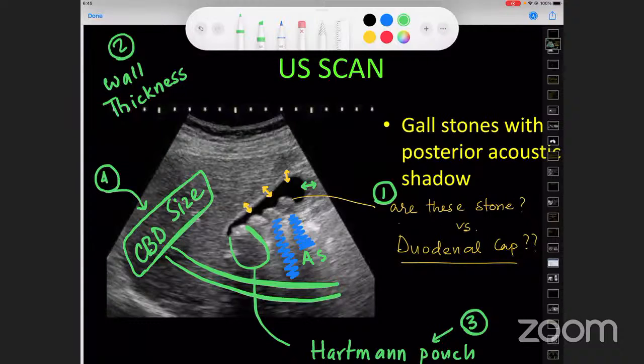Okay. So now, Dr. Bakshi, to summarize, sir, that means that when a surgeon is looking at this picture, the first thing he is asking himself is, is this a stone? I think that's a very simple one, given that we have an acoustic shadow to account for it, and acoustic shadows will indicate that this is the stone, which is more or less a very sitting diagnosis that can be made. And I think everyone in the audience can very quickly identify that these things that have been shadowed by this are something called acoustic shadows.